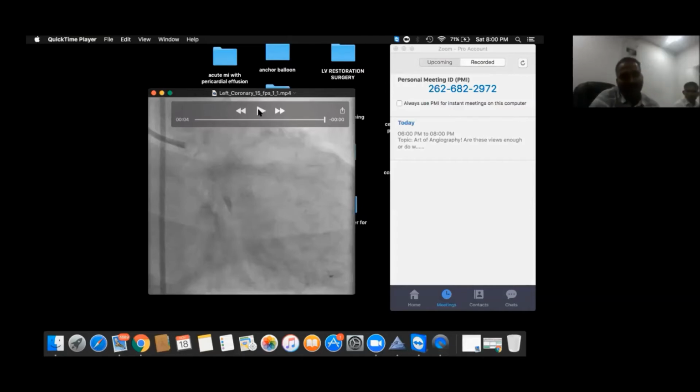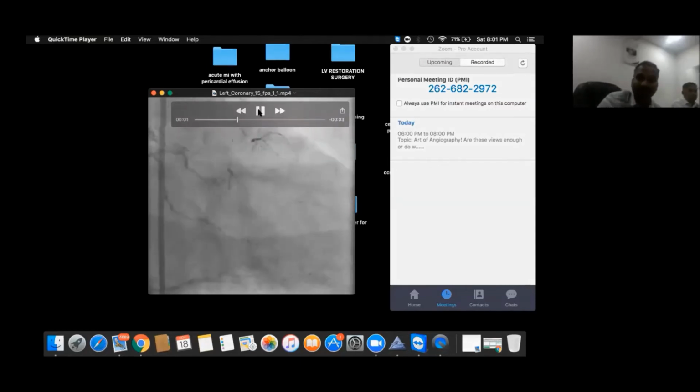That is exactly what we have to do. Many times, the moment you see this kind of picture, we try to send the patient to the surgeon. We literally dump the patient on the surgeon. But these cases are not ideal for grafting. May not be ideal. When the vessel is so small and not filling completely, it looks like there is a diffuse disease distally.